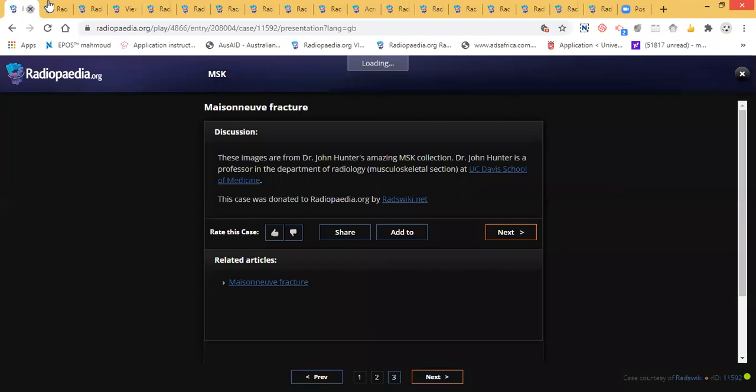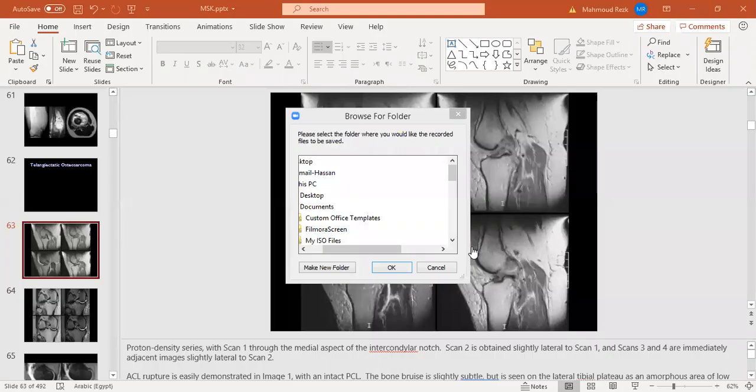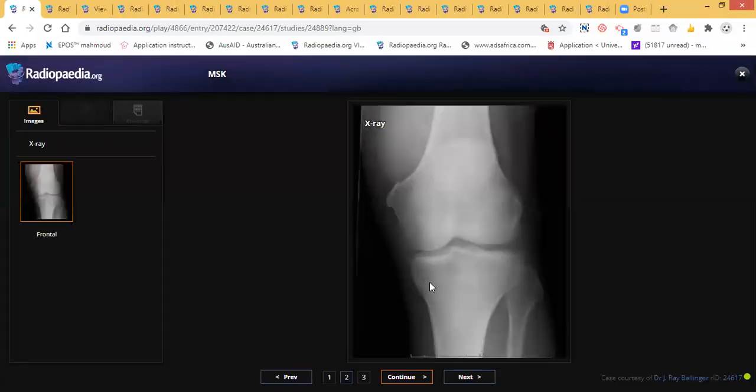Let's go to the next. If he shows you the proximal fibular fracture, you should go down and check the ankle. So you'll ask for an X-ray of the ankle, and if it is the reverse, the same. So another checklist: when you find an X-ray, you will go to your checklist. Is it bone or joint or soft tissue? Then you can consider what it could be.